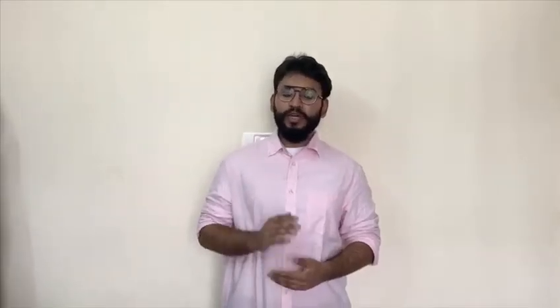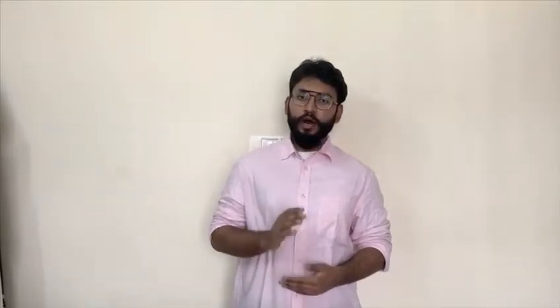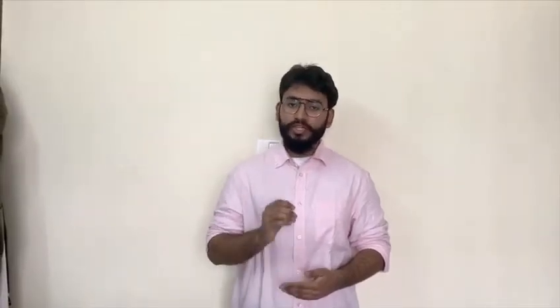Today we will talk about the radiological anatomy of the thorax. In this video we will learn how to read a normal chest x-ray. We will also take a look at some of the clinically relevant abnormalities seen on the chest x-ray. So let's get started.